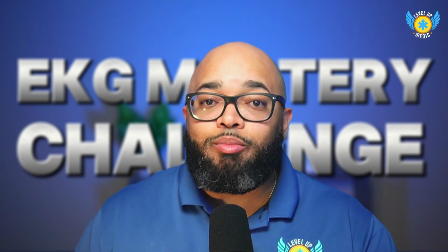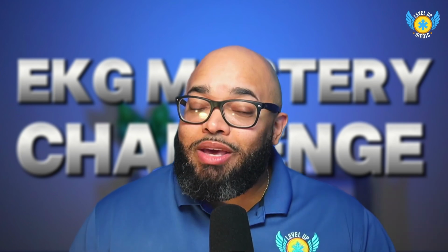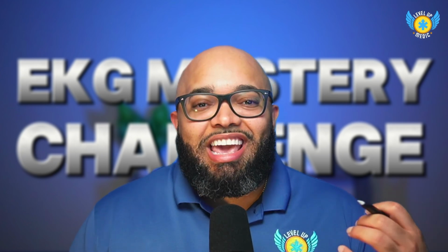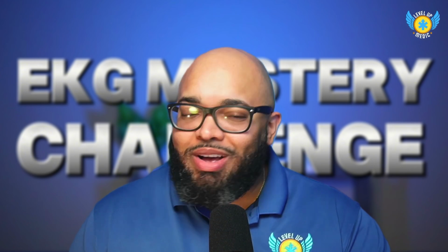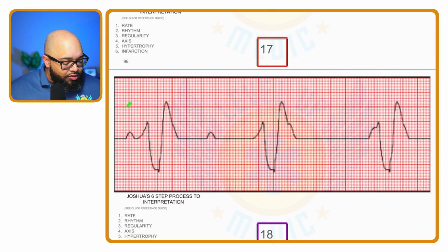We're always looking for P's, QRS's, and T's, right? And then the PR interval needs to be normal. The QRS duration needs to be normal. And the QT interval needs to be normal. Let's go look. So we have a P. We don't have a Q, but we do have an RS. And real funky looking there. Looks like we have a P, and then this is another wide complex and another wide complex.